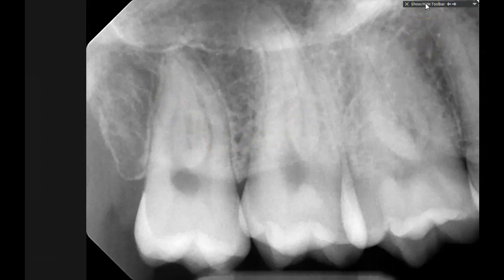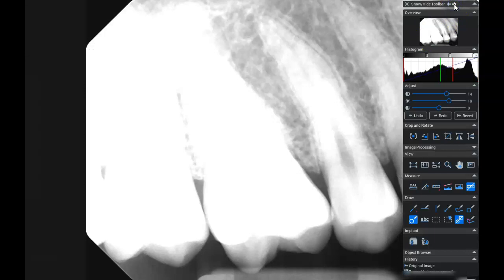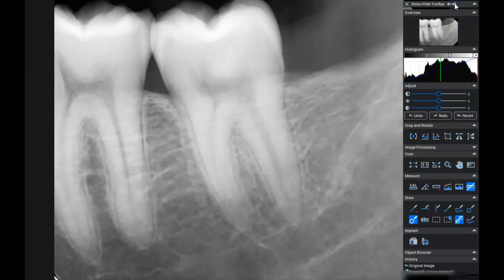The other thing that's quickly noticed is that when you open the toolbar, it hides or covers a portion of the image that you are trying to view and annotate. The resolution and the brightness can all be changed on these large images. Annotations as far as drawings can also be added on these large images, which is good. But as you see, when we scroll through this large image, going into this mode literally hijacks your entire screen.